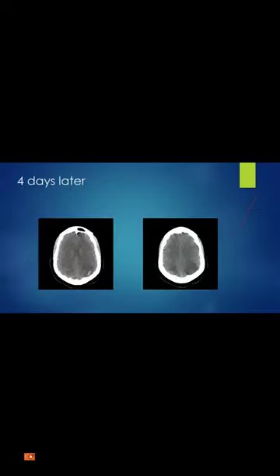And then the patient came 4 days later to our institution showing a well-established venous hemorrhagic infarction. But it was missed at the first sitting because the person who looked at the CT ran through it very fast and didn't look carefully. Pregnant with headache: look carefully at the venous sinuses.